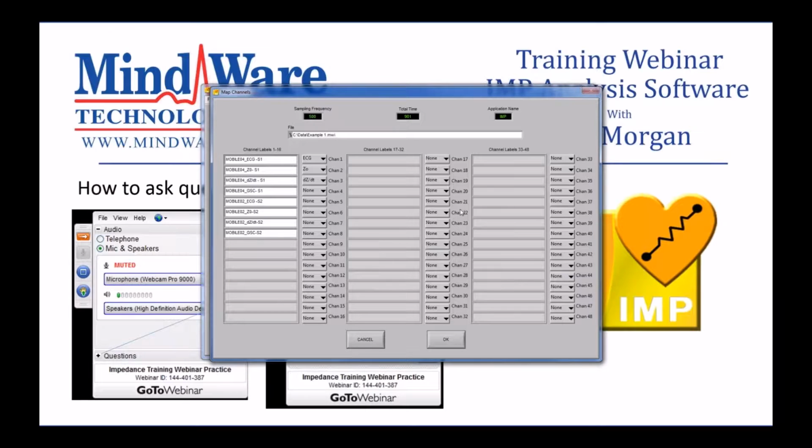And when you open that file, it's going to prompt you to select the channels that you want to analyze. This particular file is dyadic, so there are two subjects in this file. And you're only going to want to select a single subject at a time, because the analysis applications are only able to look at a single subject's data at a time. And if this were your first time opening this file, none of these would be selected, because the application doesn't know what channel corresponds with what signal. All we have here are the labels.